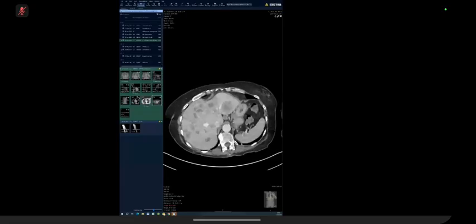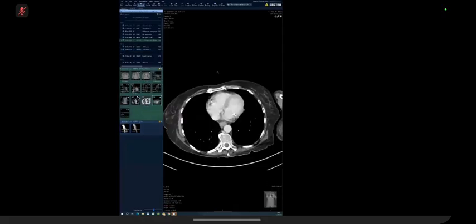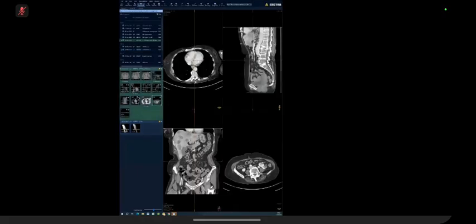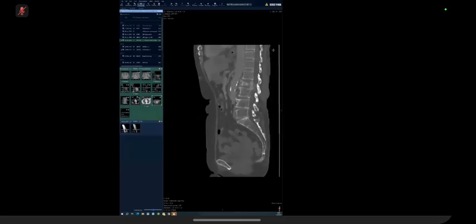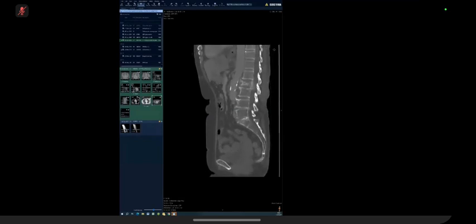You've picked one bone lesion. You forgot to say that I'm going to look for bone metastasis as well, because nobody's going to die from a pathological arm fracture, but they will get paralyzed from a metastatic spine. So this one here, you should be talking about, or if you can't pick it, you should say out loud, I would like to exclude further bone metastasis.